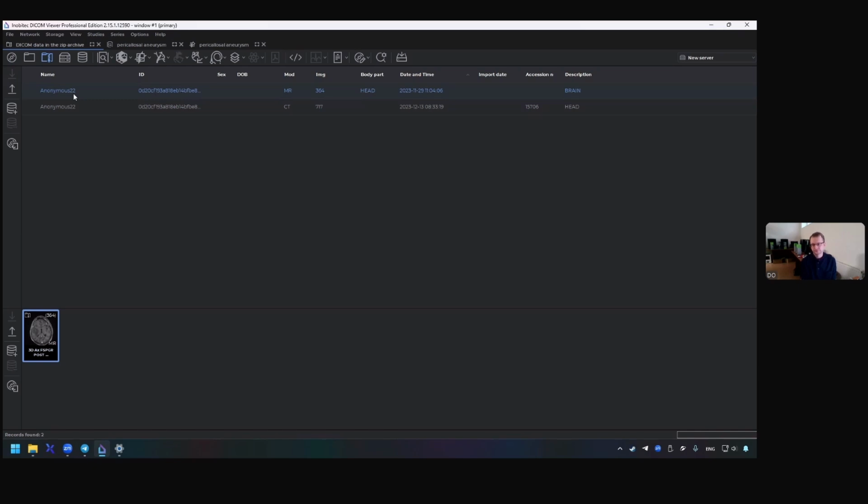We work a lot on the optimization of performance because we would like our users to run the software on a great range of devices. But it is better to have a graphics card with VRAM, video RAM, of 8 gigabytes or more for layer fusion.